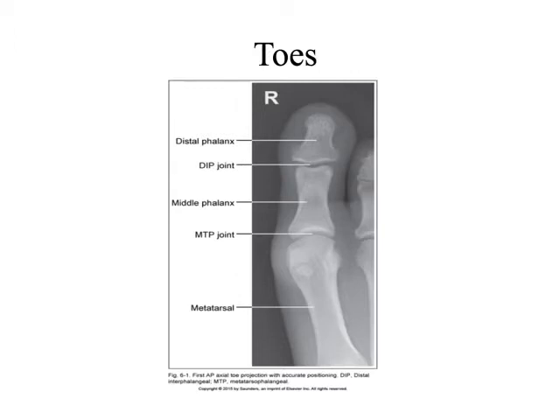Looks like the MTP joint, right? And how did we establish that? We established it in part by measuring kind of these distances here and just drawing like a little cross on here, right? So in addition to knowing where we're centered, doing that measurement has also told us what's aligned to the image, right? We're more or less aligned to the long bone of this metatarsal, right? And these middle phalanx. What else can we say about positioning for this piece of anatomy?